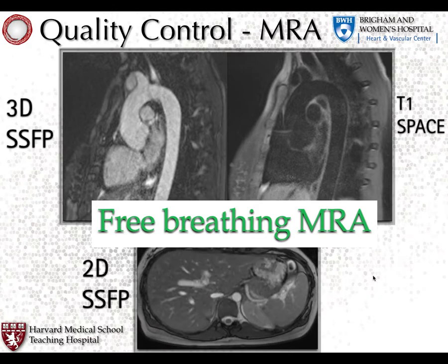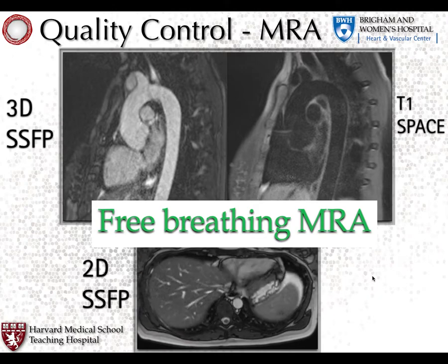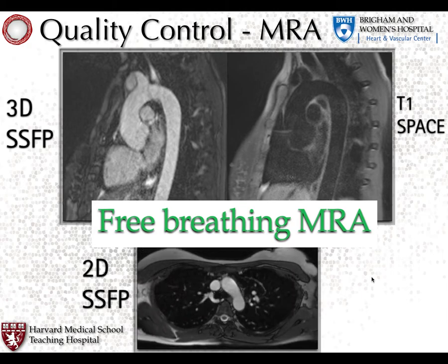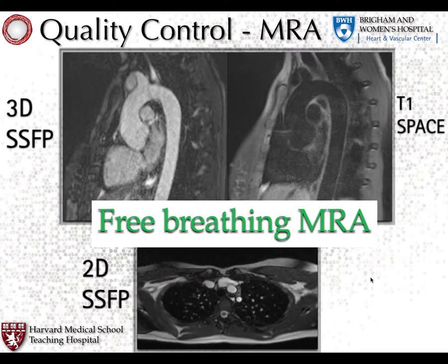It's just a second. Well, we're just acquiring 1 phase of the cardiac cycle, right? And that's the other reason. It doesn't really matter what part of the cardiac cycle you're in for that. Now, you get a better quality image if you do it gated.